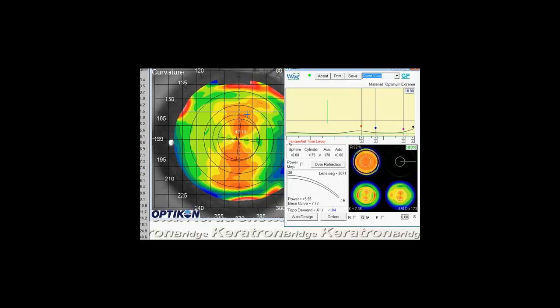But we're going to look at the cornea. On a regular cornea, we're looking for that area in the mid-periphery where we have the most change, where this color sometimes goes from a yellow to a green, or a green to a bluish. In this case, when you have cylinder, you want to see where the cylinder kind of ends. The optic zone is going to just maintain that same rate of curvature until this red dot. So that's our central base curve.